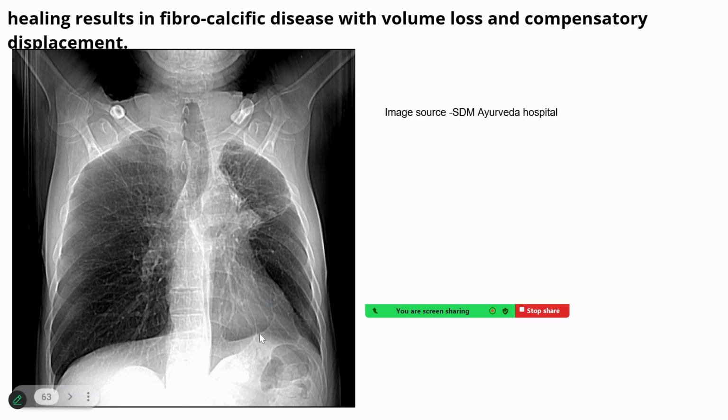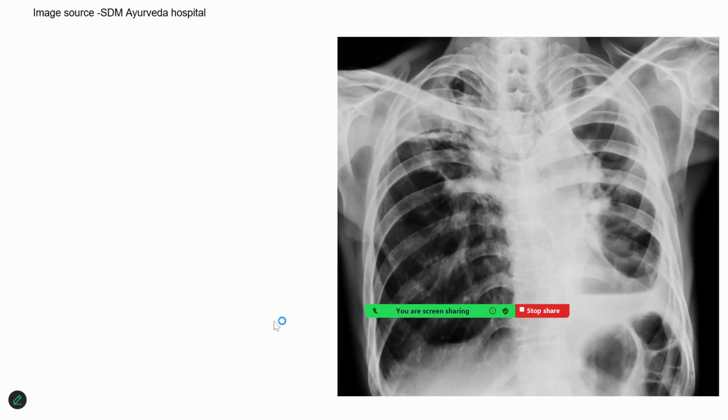Or shift of the diaphragm having that tenting effect seen also is one of the characteristic features. Now, these displacements could be very severe, producing a very huge asymmetry in the lung tissue. Multiple folds could occur in a typical tubercular displacement. And as I told you, these are the more common varieties of tubercular pathologies. In these patients, the tuberculosis need not be active.